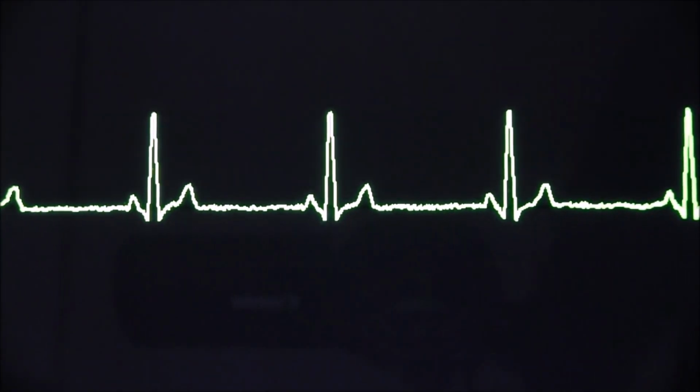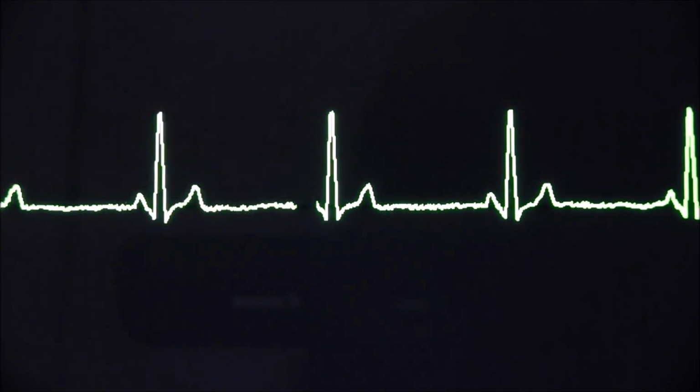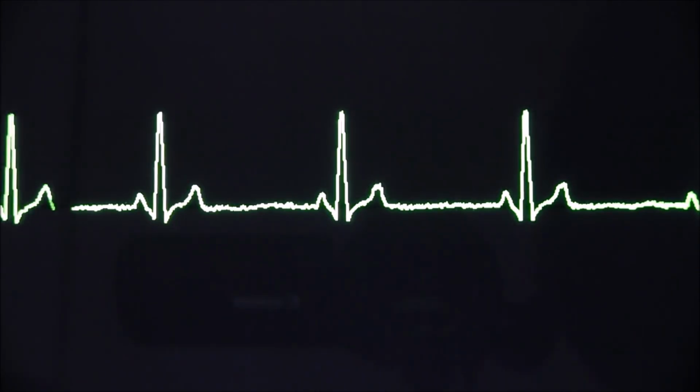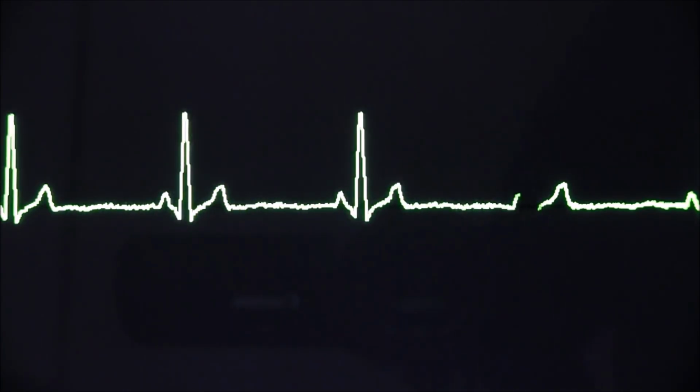So a sinus bradycardia. Brady means slow. It's still a sinus rhythm because it's generated in the sinus node, as we can see by the normal PQRST complex, but the rate is less than 60. So a bradycardia has a rate less than 60. So it's a sinus rhythm if it's 60 to 100. It's a bradycardia if it's less than 60.